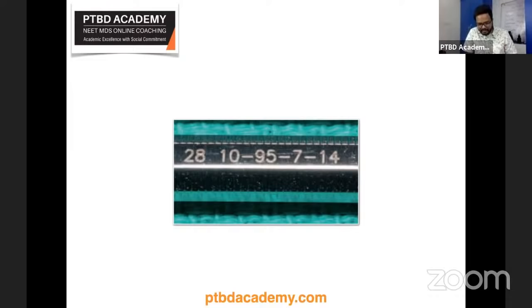When the second number in the instrument formula is 90 to 100, mark my words, 90 to 100, the instrument is used on the distal gingival preparation wall. If the second number is 75 to 85, as already discussed in our classes, it's used on the mesial. The 75 to 85 pair is used to remove unsupported enamel on the mesial gingival wall of the preparation. 75 to 85, it's mesial; mesial will be comparatively less. Distal is 90 to 100, as given in Sturtevant's. No confusion whatsoever. Make a note of the same.